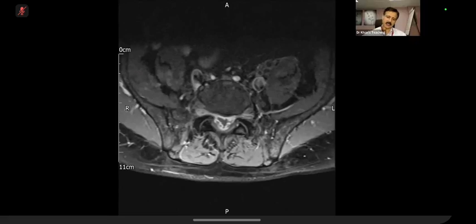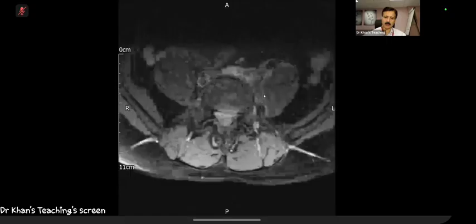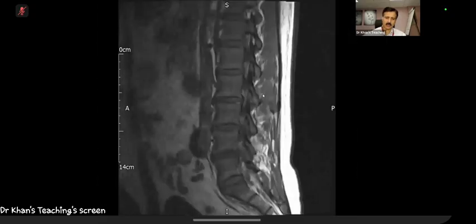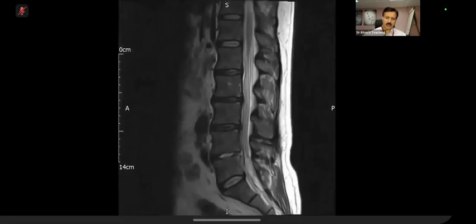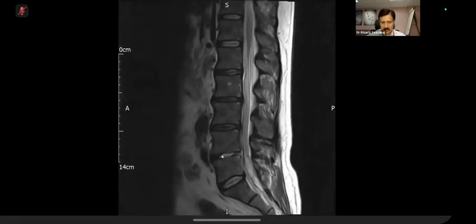Okay, fine, excellent. So basically, you have picked up a spondylodiscitis. Okay, let me go through it with everybody. Now, this is a T2 weighted sequence. The key finding here is look at this disk.